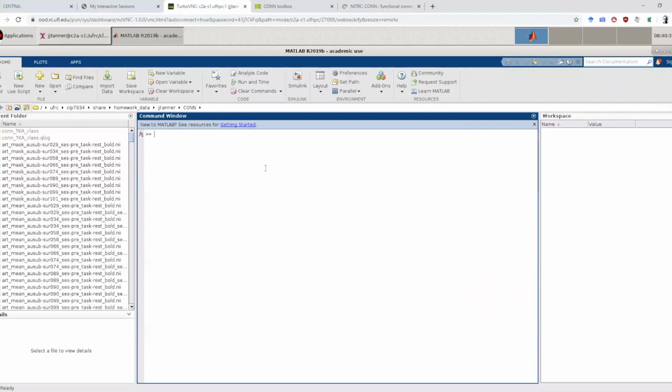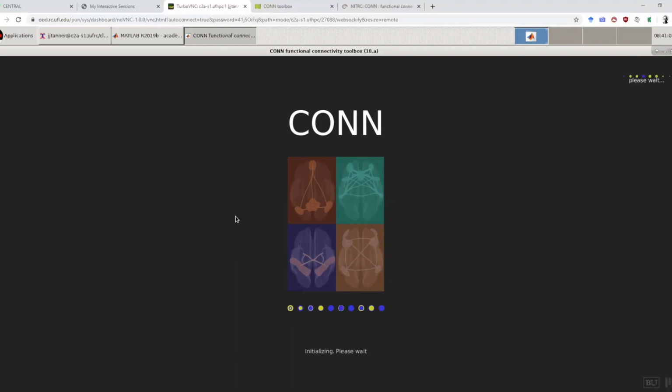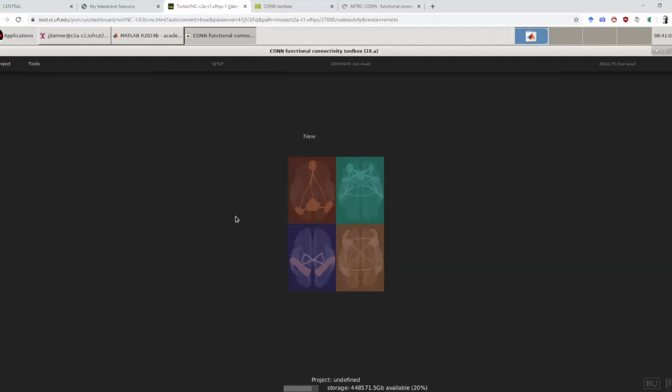So if you have MATLAB running, you just type CONN and press enter, return. Again, the faster way is just to do that right from the command line from the console, MATLAB-R CONN, and that will speed up this process so you don't have to do over 2 commands. So CONN will just take a little bit of time to run, depending on how bogged down the VPN is or Hypergator. For the GUI access, it can take a little bit longer amount of time. This is being reasonably quick.